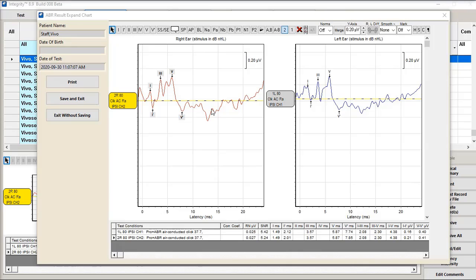In the Database Expanded window, you can calculate the interaural difference similar to the test screen. So, either you can calculate the interaural differences on the test screen during testing, or you can save it and calculate the interaural differences later from the database.